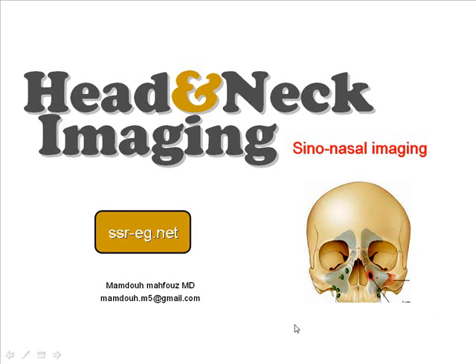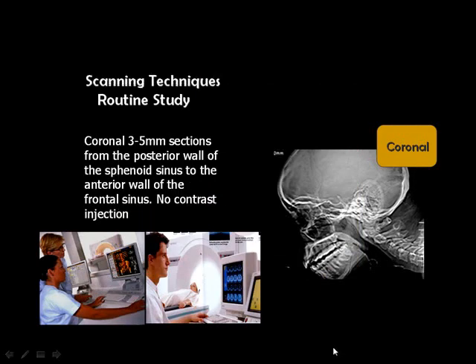And actually, you all know that to examine the nose and the paranasal sinuses in radiology, we have two main examinations. The first one, which is known as the routine study, is performed while the patient lies in the prone position, and we obtain a coronal scanogram. Then we identify the area to be examined from the posterior wall of the sphenoid sinus, and we proceed anteriorly until we finish the frontal sinus, and we usually align the scans perpendicular to the hard palate.